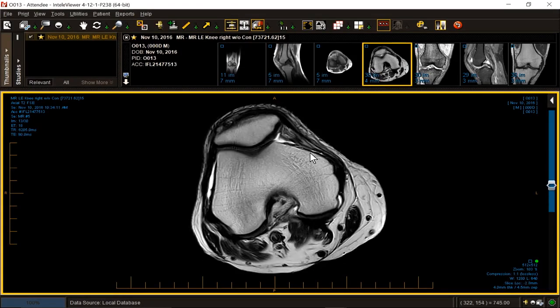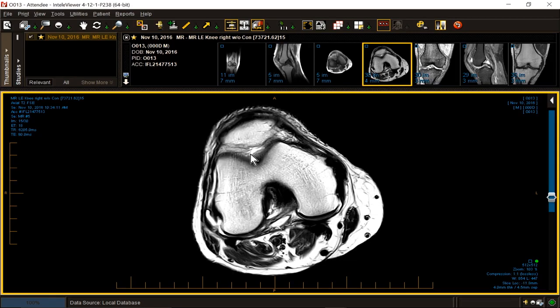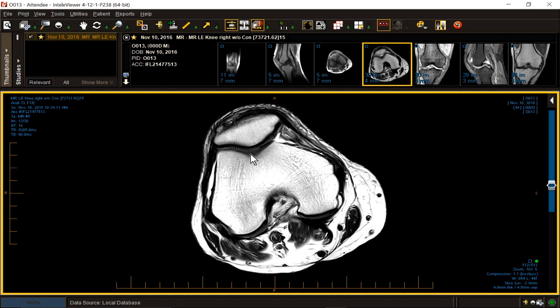All right, so I've got my axial up. I'm noticing the proliferative bone in the anterior patella, which is known as the tooth sign of Keats. It's a sign of enthesopathy and rubbing of the prepatellar plate, often asymptomatic, but occasionally associated with delamination tears of the prepatellar plate. This patient has an asymptomatic delamination type tear of the prepatellar plate. That's not his problem. Nor is this small fissure in the trochlea. That's called living.